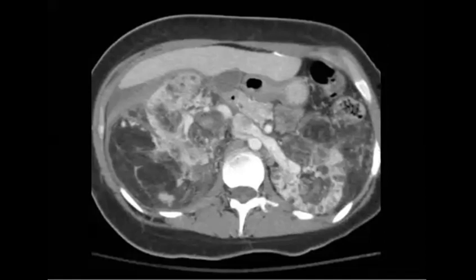What happened with this patient? There is, what happened? Rupture. Perfect, Nermeen. So what happened is rupture, because you can see that there is a collection outside or adjacent to the right aspect here. Yes, so this collection and here, yes, ascites. So that means that this patient has a ruptured AML. So this is one of the complications, as you know.